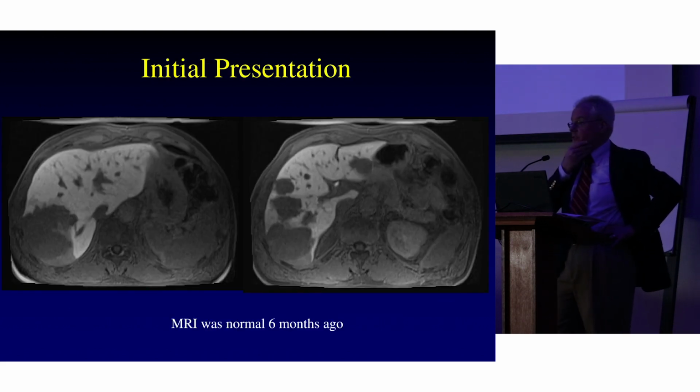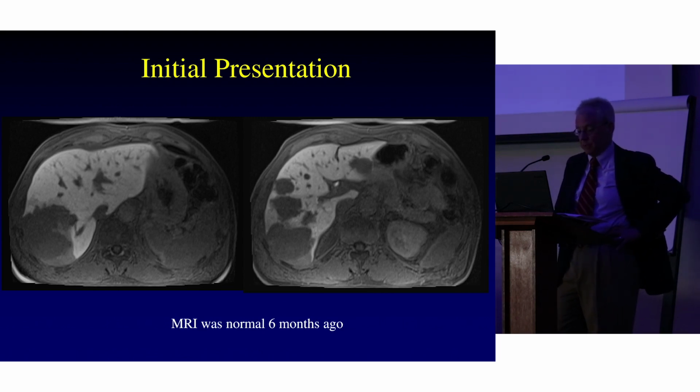Okay. Just to show a couple MRs of two different patients who I've seen over the past couple years.